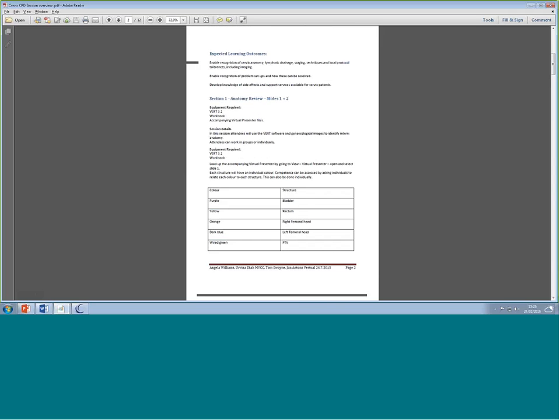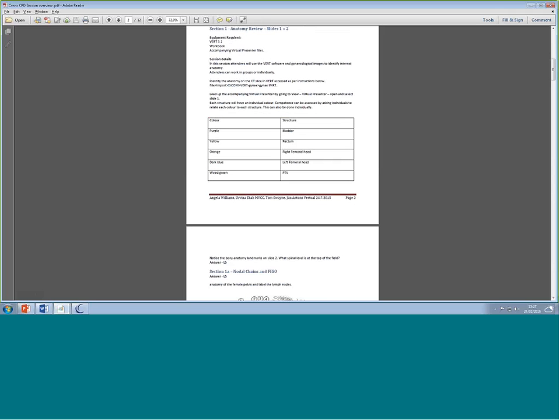If you're looking at this first page, it also explains how you get into the cervix. And I'm going to talk about the cervix as I've created this one, but the prostate one is very similar. How you get into that VERT session, and with that, if I go back. So how do I go back?